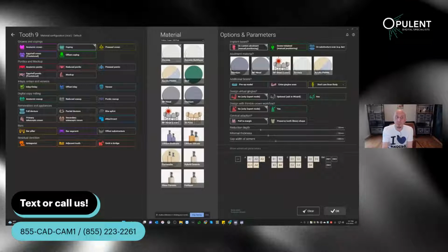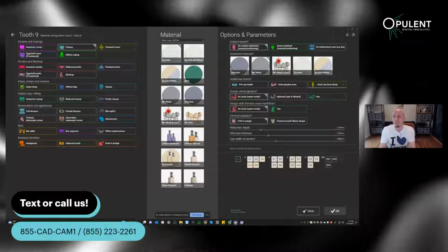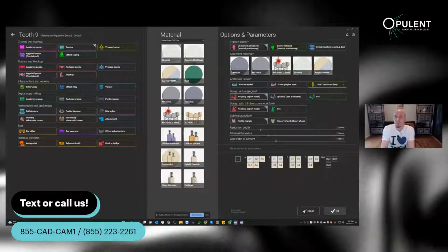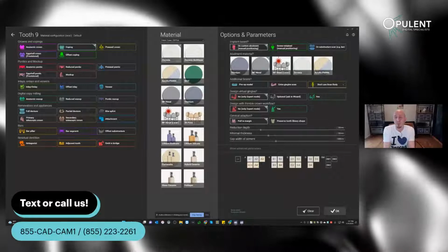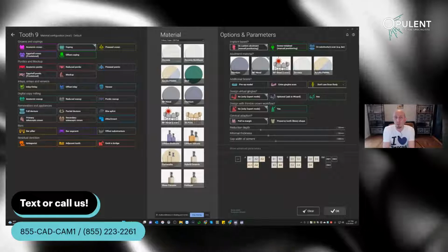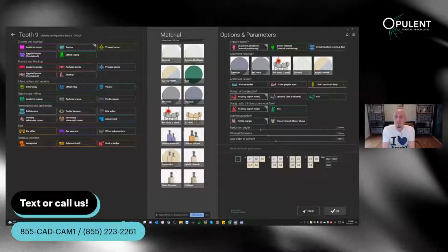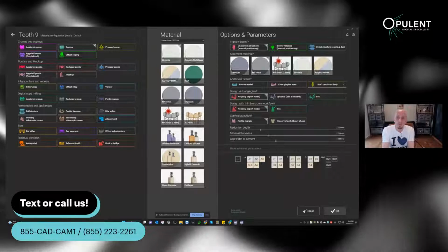The other reason could be the part is all correct and it fits all well, and you are maybe realizing, oops, there's no room available. What am I going to do? You're maybe starting making phone calls with your doctor and warning them, hey, I need to modify that. The minimum thickness in the implant library may not allow you to go below that.